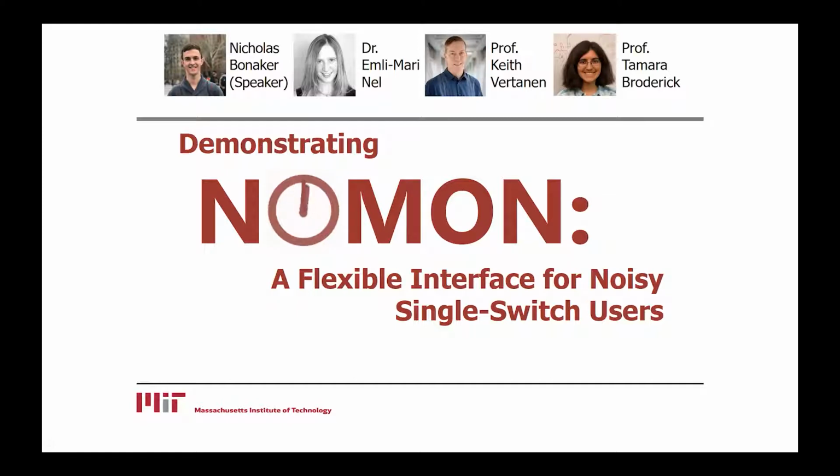In this demo, you'll learn to use the Nomon interface through our quick tutorial. You'll then have the chance to compete in a competition with fellow CHI attendees to see who can type the fastest and most accurately using Nomon.